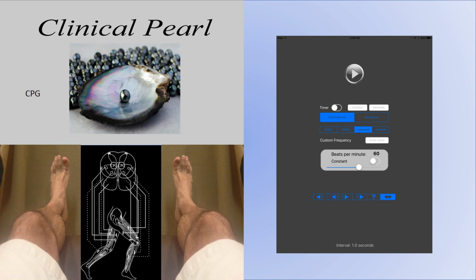So with the combined mode selected and the reciprocating mode selected, the 500 Hz on one ear and 100 Hz on the other ear are going to reciprocate back and forth between left and right. Again, we usually tie this into reciprocating electrical stimulation left and right. You can also do it on a stationary bike. If you do it on a stationary bike, or a treadmill for that matter, you can set the beeps per minute to coincide with the normal gait rhythm for your patient.